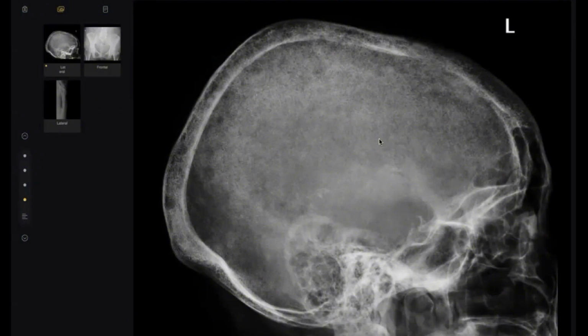You can ask the examiner about the age or anything else, for example whether the patient has renal failure. More than 90% of cases of hyperparathyroidism, even in the exam, are due to renal failure. So, my friends, it was a case of polyostotic Paget disease.